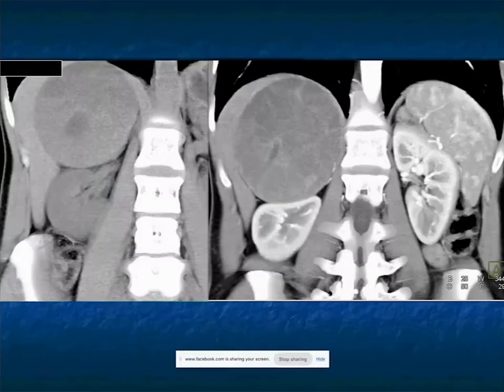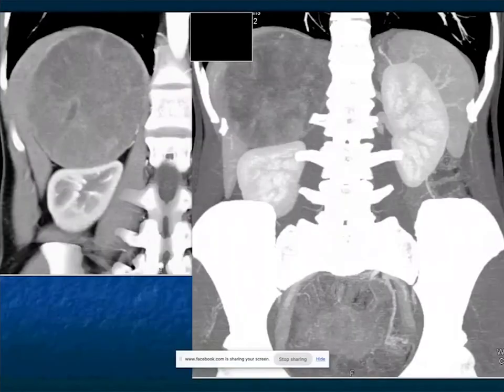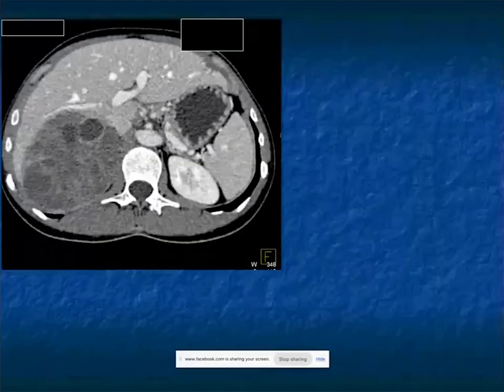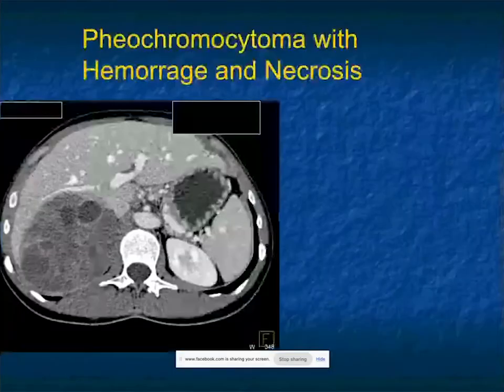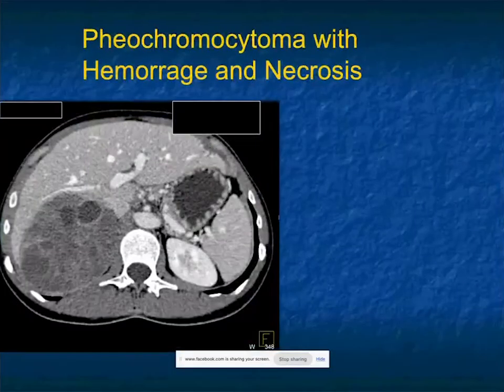You got to be thinking about things like adrenal cortical carcinoma, metastasis in the right clinical scenario. Maybe because it's enhancing and necrotic, pheochromocytoma is a possibility. You're not thinking about adenomas or myelolipomas. You're thinking ACC, pheo, metastasis. A few more looks at it, and this was a pheochromocytoma.